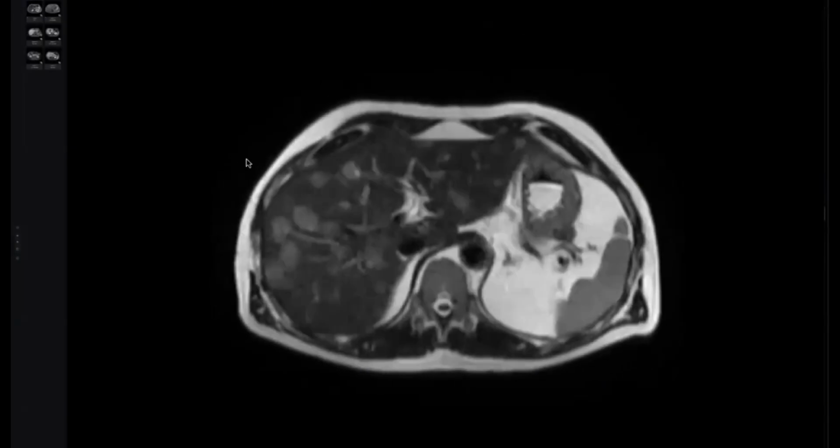Look here, my colleagues. Despite the large number of these lesions, there is no mass effect. Look at the vessels here. Each vessel is respected. So you should think and tell the examiner it may be benign. Why? Because there is no surrounding edema, no mass effect, and it respects the anatomy.